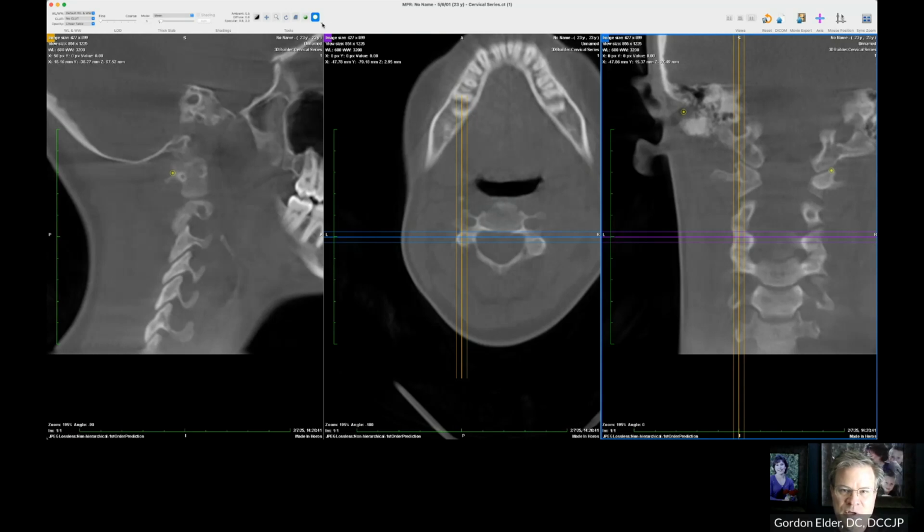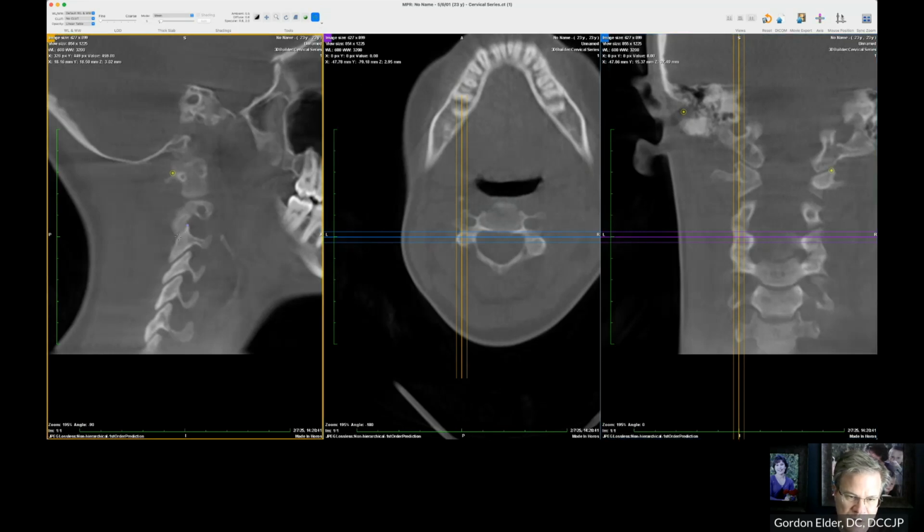But we don't need them to be super accurate because we have a variable line of drive adjustment. We need to be in the ballpark. We want to be as accurate as possible. I think a friend of mine said, the art of a precise estimate.